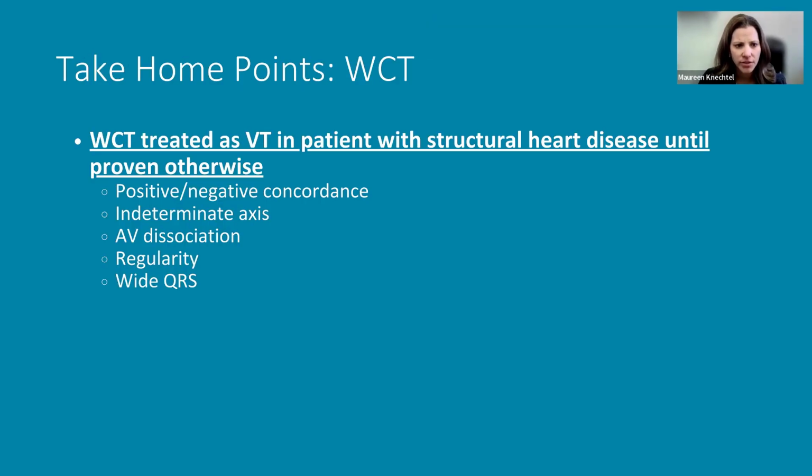Okay, let's look at a list here. So as I said, treat it like VT until proven otherwise. There are many different criteria. Again, Wellens coming back in. These are Wellens criteria. There are Brugada criteria, which are a little more recent. But I think clinically, these ones are very, very easy to identify.